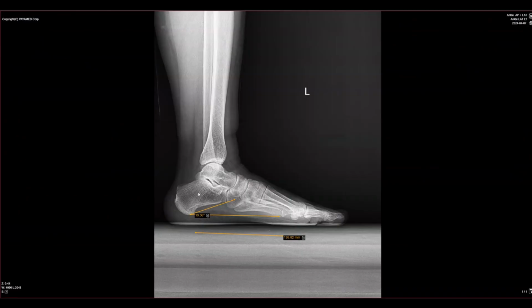our conversation going. I've already started to look at the angles. I wanted to dig right in, and right away I'm getting a measurement of the calcaneal pitch angle from the base of the fifth to the calcaneus to the calcaneocuboid, coming into a normal range.